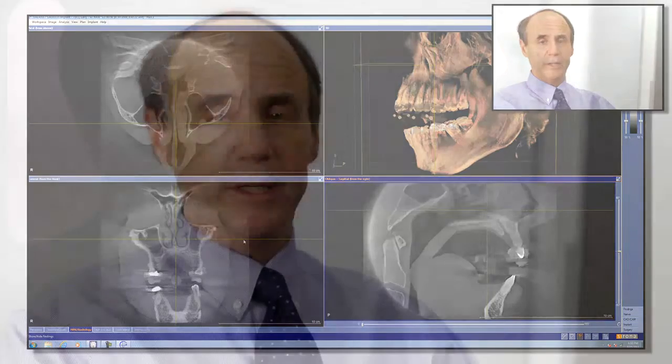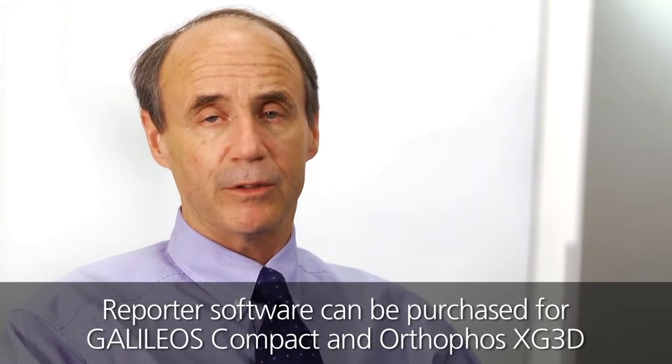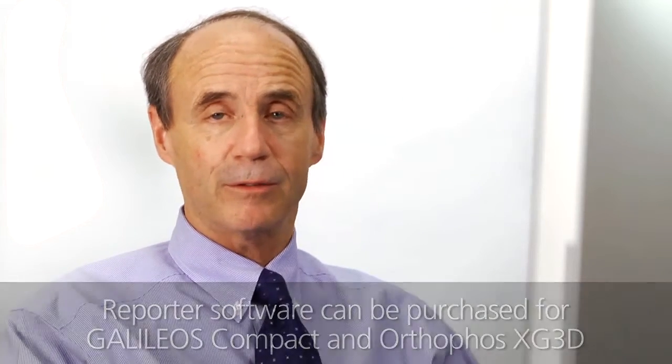So that is a proper way to go through the volume of a patient, which should be done for each patient. With training, it would take about 5 to 8 minutes for each patient. But be sure to go up and down, back and forth in the axial and coronal views in order to thoroughly evaluate for any abnormalities. And again, if there are any questions, refer the patient scan or several pages of reporter to an oral and maxillofacial radiologist, or if in your opinion a biopsy is warranted, to an oral and maxillofacial surgeon.